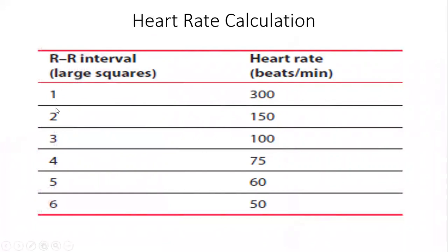So if you have your R wave over there and the next R wave over there, you look at this interval and you count how many large squares, large blocks, are in between your R waves.